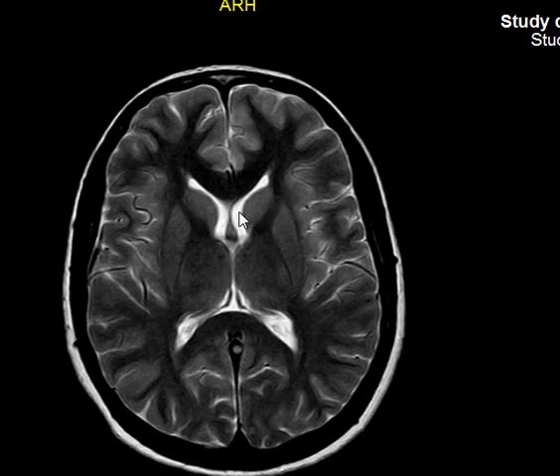So far, is everything okay? Good. So the basal or deep gray matter includes the head of the caudate nucleus, the lentiform nucleus, and the thalamus. The lentiform nucleus is composed of globus pallidus and putamen. Globus pallidus, putamen plus caudate equals corpus striatum.